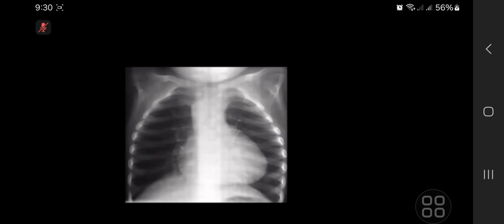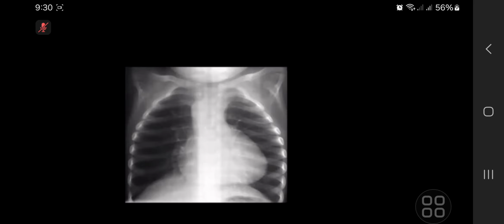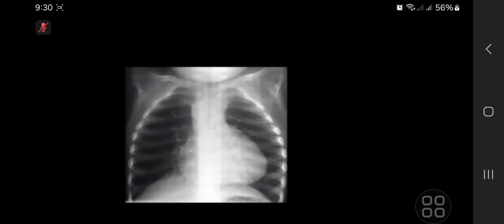Sure. So this is a chest radiograph of a pediatric patient. Since these are cardiac cases, do the sequential analysis, starting with the apex. I'm starting to look at the cardiac silhouette. The apex is elevated, and the size and location of the aorta is central.